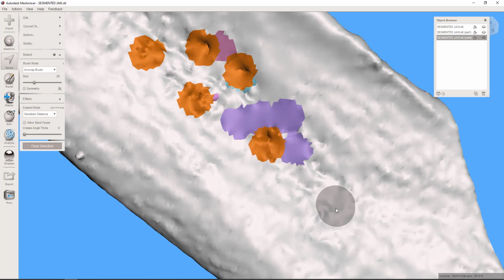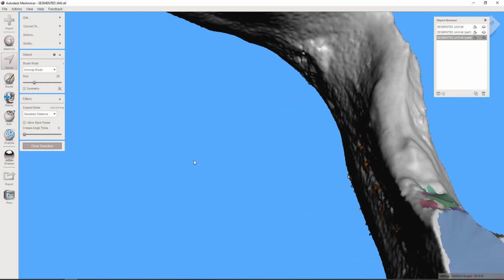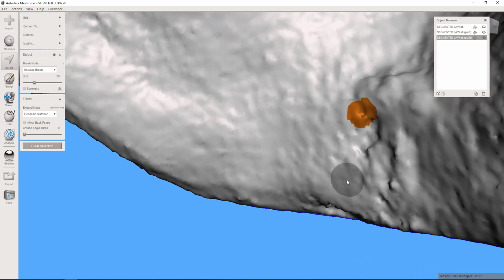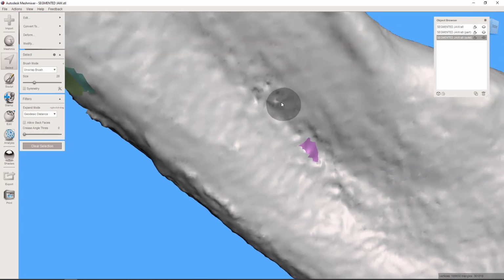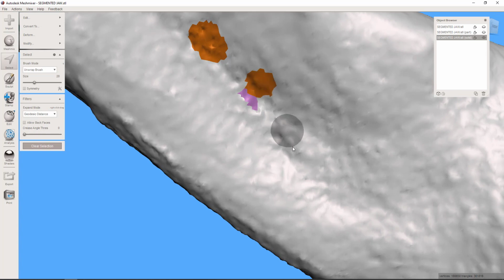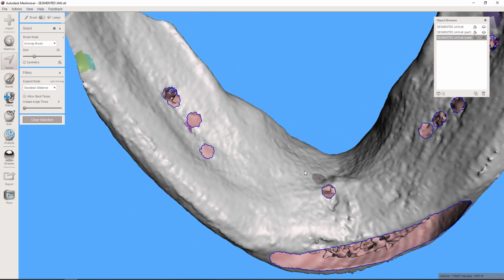And anything I even remotely suspect is still connecting it, I'm going to go ahead and get rid of. Like maybe that. I don't know. But those look suspicious. Okay, let's delete that.